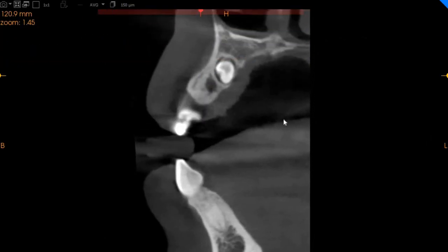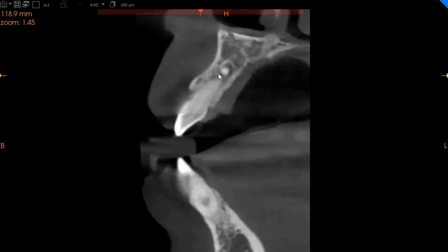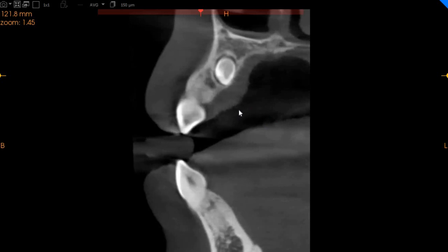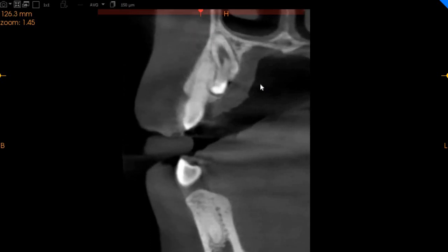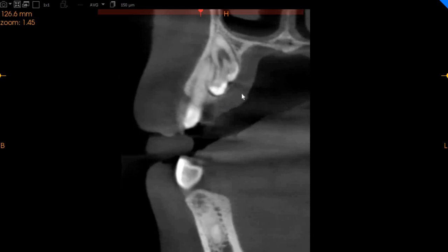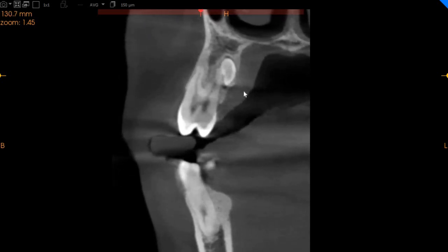So here, if you focus right here, this is starting from the upper left lateral incisor, which is right here. We move towards the canine, and we see the first supernumerary tooth right there. You can see the anatomy of the supernumerary tooth is tooth-like. This is where the apex is, and then moving further forward, we can see another supernumerary tooth which has multiple crown segments, and it seems like a gemination-like appearance. And then we've got a fourth supernumerary tooth right here close to the upper left 4.